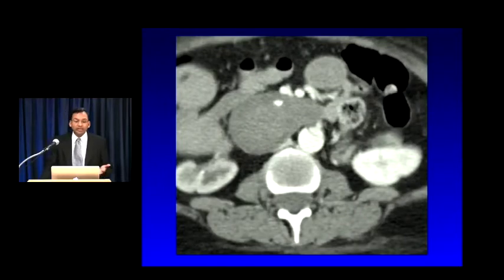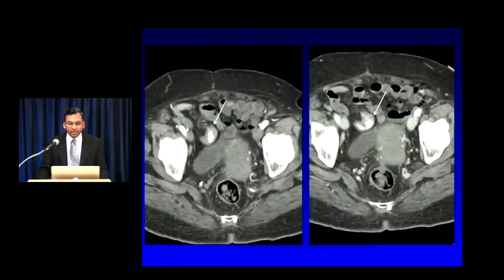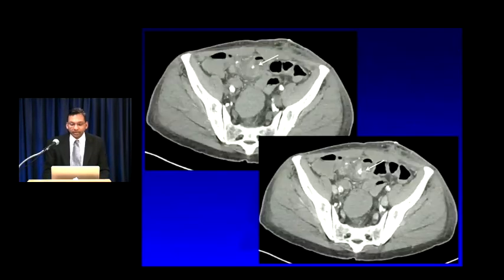Here's an example of an active extravasation in the duodenum. Notice all the hyperdense clots surrounding the site of bleeding. And here's a bleed in the right lower quadrant small bowel. Notice that between the arterial and venous phase images, this bleed is getting bigger. It's changing in morphology. The two features you really want to see in order to differentiate intrinsically high density material from an active bleed. Here's another example.